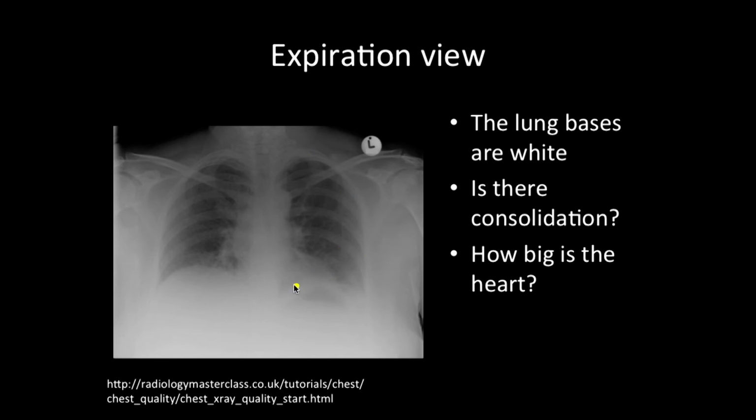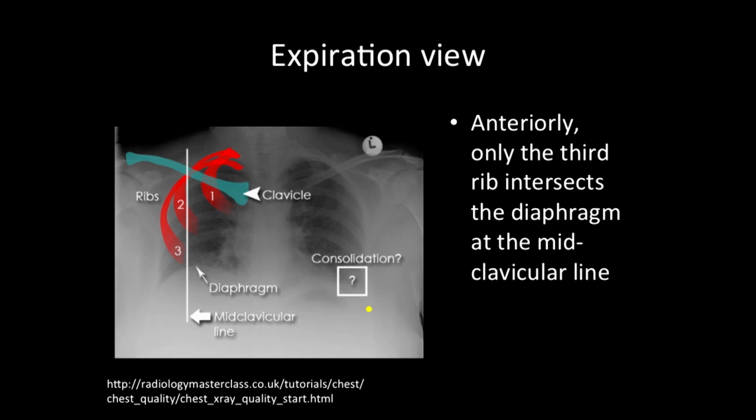Mm-hmm. So you'd be a little bit hard-pressed to say that there wasn't something going on here. So it's an inadequate inspiration, and you'd be worried about anything going on at the left base. Could you comment on cardiomegaly in a patient like this? Very, very difficult, because if they take an inadequate inspiration, often the heart can appear much larger than normal. Great. And again, to just point out what Dr.